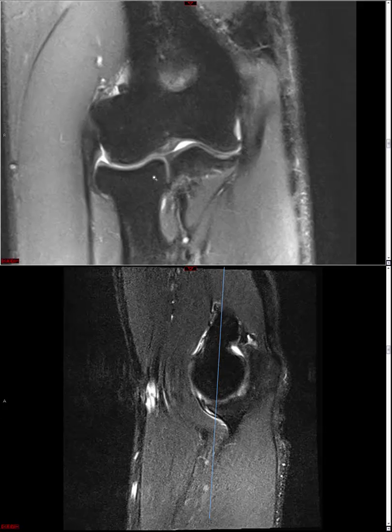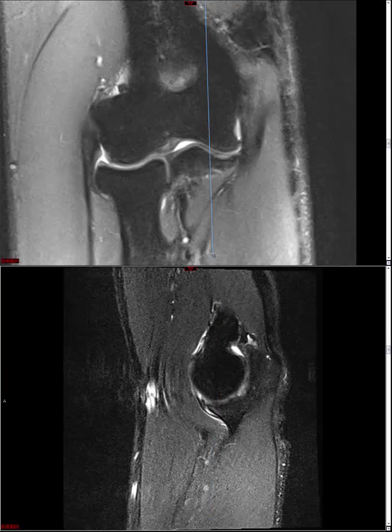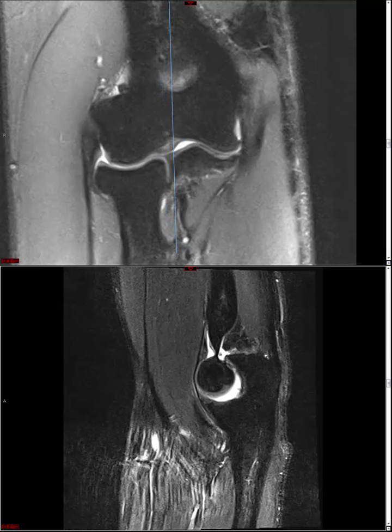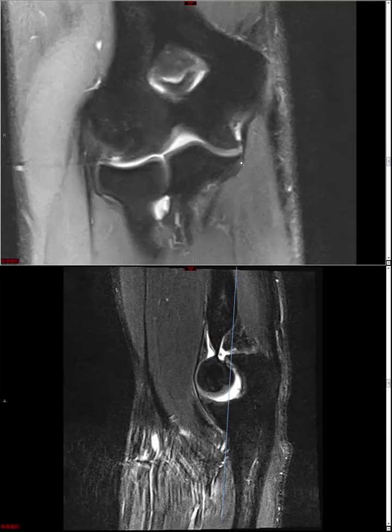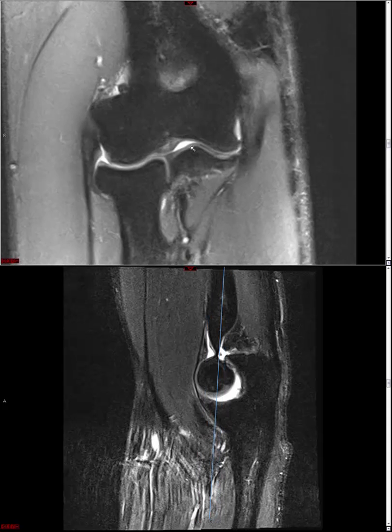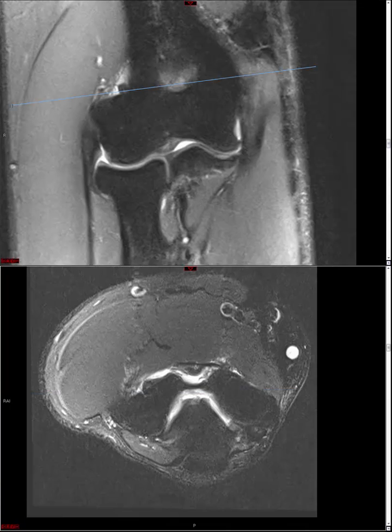I'll leave it up to you whether or not you decide to numerically grade your cartilage. Some of our arthroscopists do, so I don't think it's inappropriate to. It will depend on what the practice pattern at your site is. And I also do like to give some indication as to whether the cartilage involvement we note is focal or diffuse, and in this case you should also indicate whether you're seeing it in the radiocapitellar articulation or the ulnohumeral articulation.